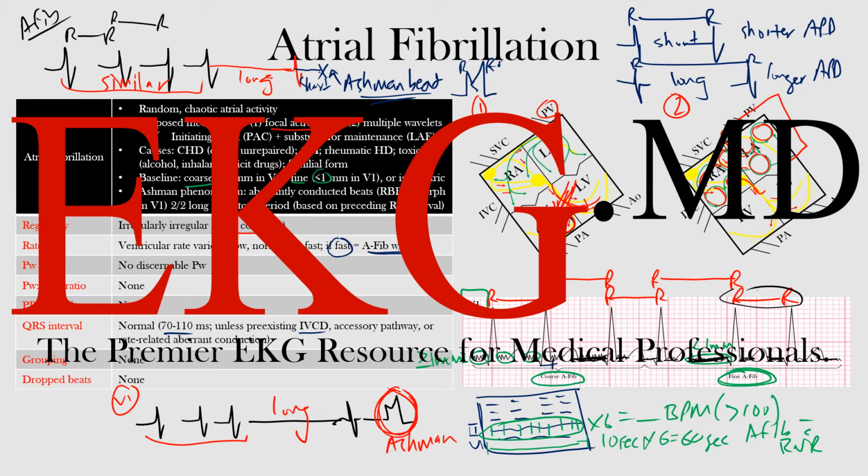So again, if there's a sudden lengthening of that QRS cycle, as we saw here, and again, this has to be an AFib, the subsequent impulse with a normal or short cycle duration may be conducted aberrantly. Remember, we have a relatively long cycle followed by a relatively short cycle, and the beat ending the short cycle we call the Ashman beat, that often has that right bundle branch block morphology. So that's Ashman phenomenon, and probably a little more than you need to know, but something you can impress your colleagues with. So let's briefly review our chart to make sure we didn't miss anything.